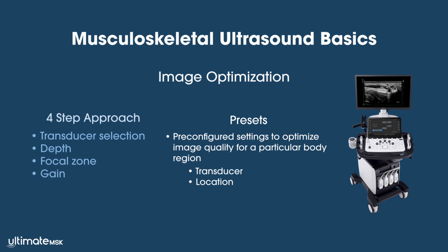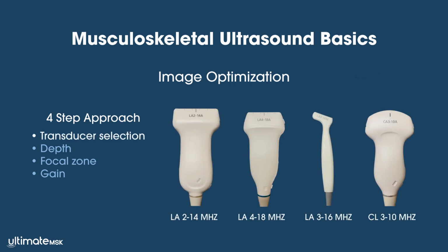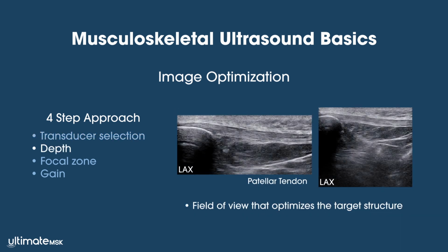I will present a 4-step approach that will be sufficient in most situations. The first step is transducer selection, which I have already touched upon. Once the optimal transducer is selected, the next step is to adjust the depth. The depth setting should aim to create an appropriate field of view that optimizes the resolution of the target structure.